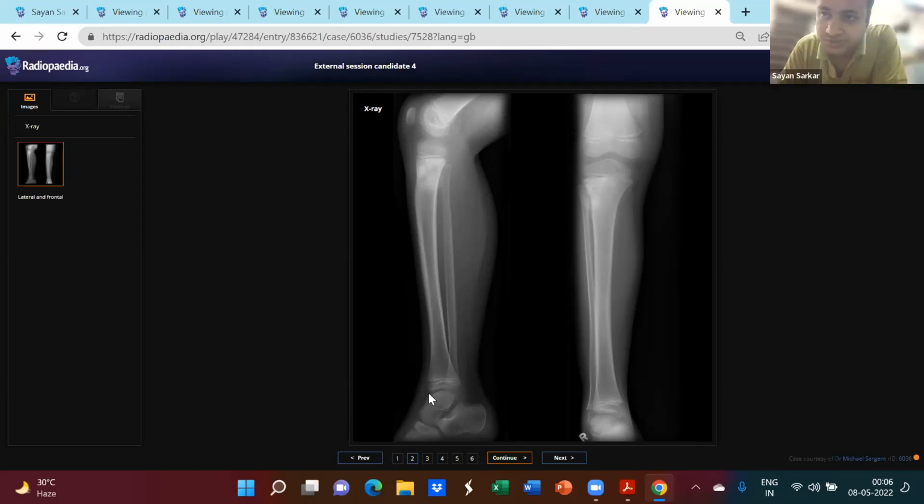Calcification you told, right? You told one point as calcification. So what does that mean? What are you trying to see? Calcification is a subpart of what broader category? Mostly malignant etiologies. No, not that. I'm saying that calcification falls under which characterization?